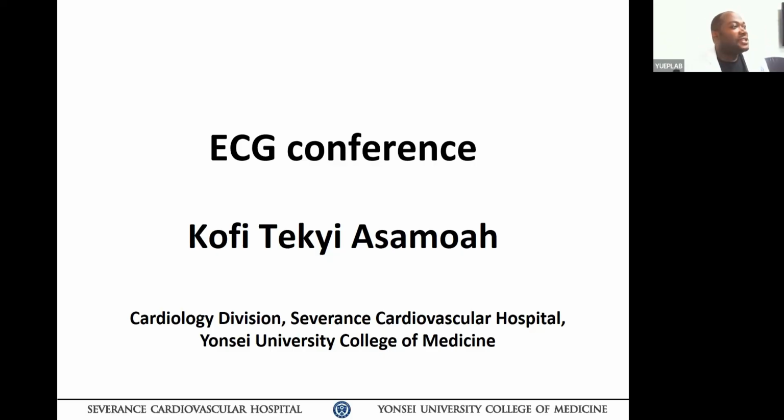Good morning. I'm Kofi Techi Asamoah, and I'll be presenting today's ECG conference. We are going to have a series of ECGs all belonging to the same patient. I think we have a total of 5 or 6 ECGs to look at, so go right ahead.